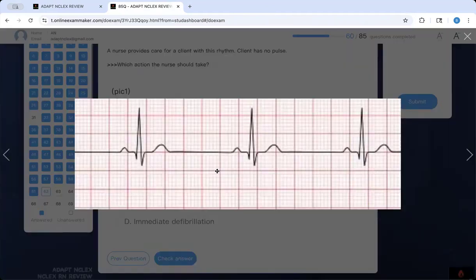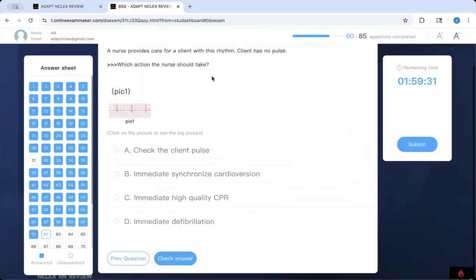What kind of rhythm is that? This is what we have. Same thing. You can see this rhythm is slow, it is what? Sinus, and the heart rate is low. The PR interval is normal. It's not that fast like the one we saw. It's not that long like the one we saw. This is normal. Therefore, this is classic bradycardia compared to the other one with first degree.